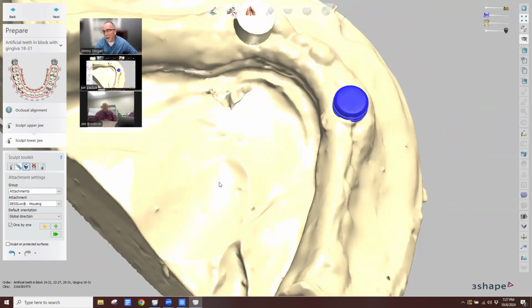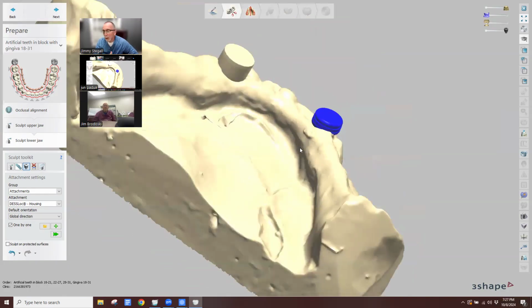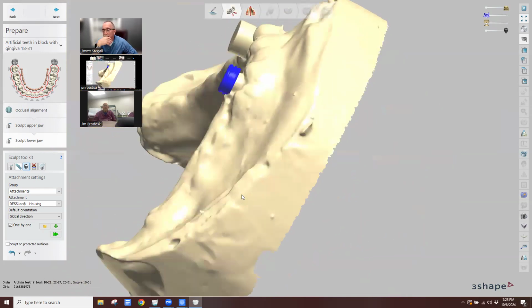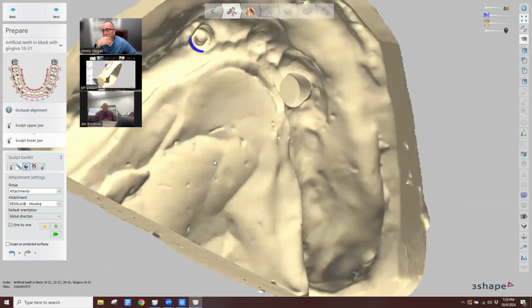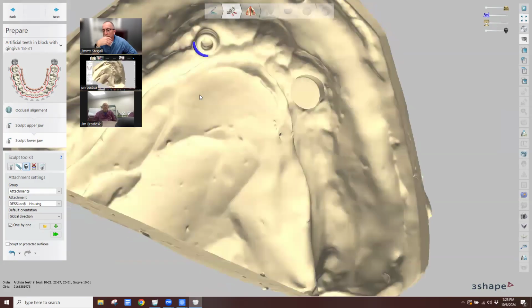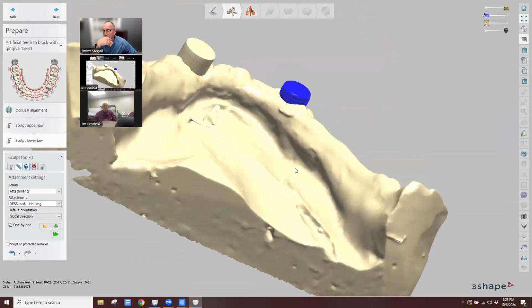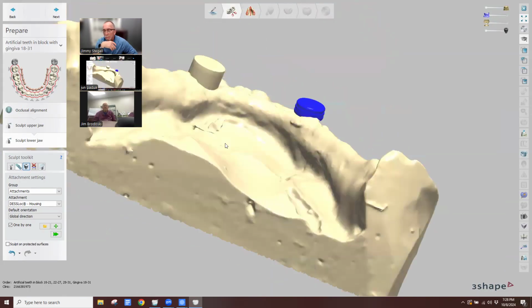Now, if it's in the shape of the exact housing, that's not quite big enough. So it's still going to take me a second to stick a burr in there to open it up a little bit more, because I need room for the bonding resin. But some people like that, and they're of course easier to line up. But I also found they put the little nodule of the button that I have to knock down too. But it's okay either way.